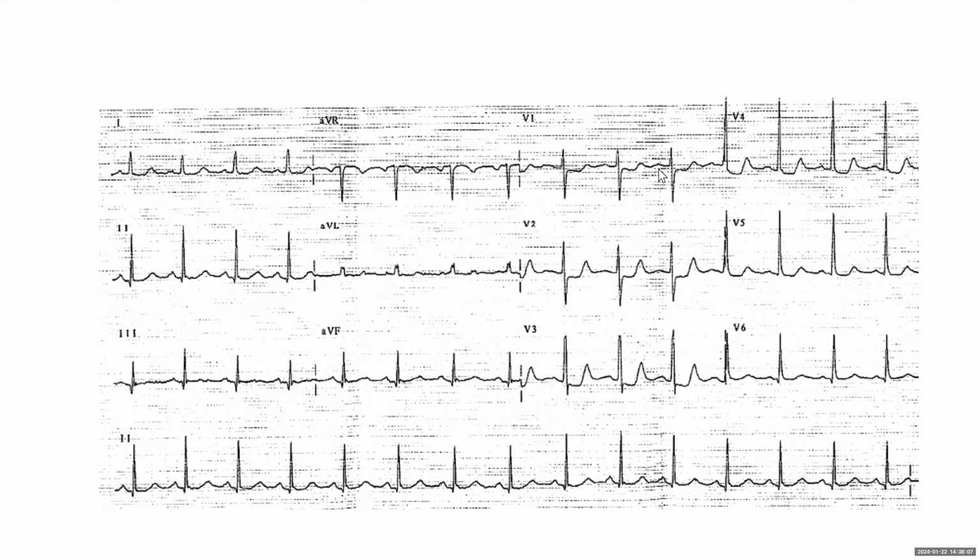Okay. And then electrical alternans. So you are right that the voltage, the amplitude of the QRS changes. If you follow my mouse, it comes down and then up. Do we call that electrical alternans? Exactly. This is the respiration. This is change in respiration. Electrical alternans is beat to beat. Okay, beat to beat change in the amplitude. Good. Excellent.